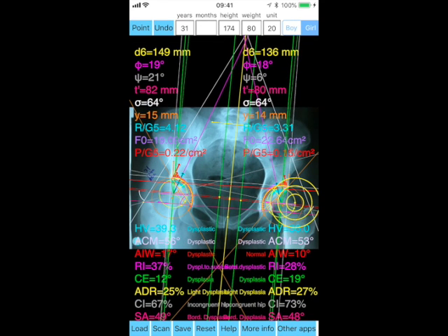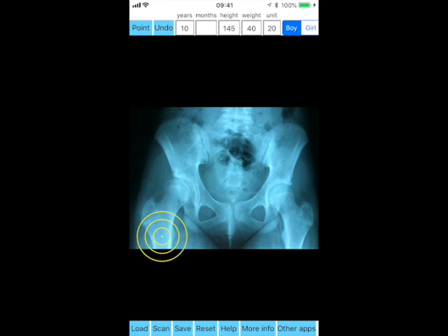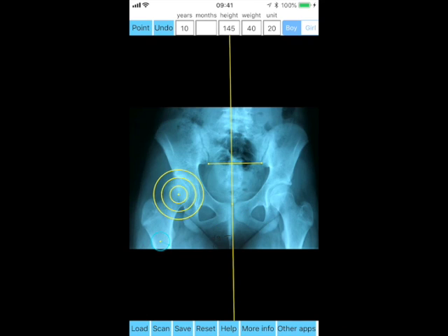In quick view, you have to choose sequentially and manually certain anatomical landmarks, points, which are shown below, with the correct order. Calibration procedure: C1, center of a known dimension object; R2, dynamic circle radius of the known dimension object, for example 10 mm. Enter 10 in the unit box.